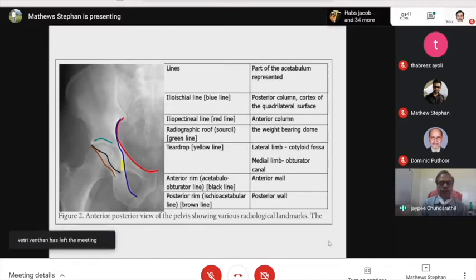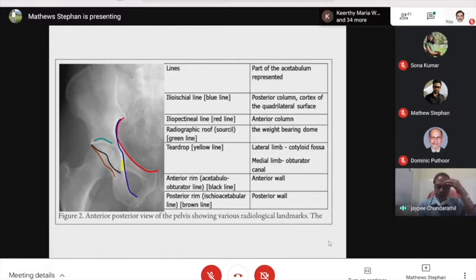So a proper X-ray should demonstrate at least L5 and the sacral upper limit, because you have to know certain basic anatomical facts with respect to the iliac crest, the Shenton's line, the lesser trochanter, etc. to assess this. So getting a proper X-ray is the first basic thing.